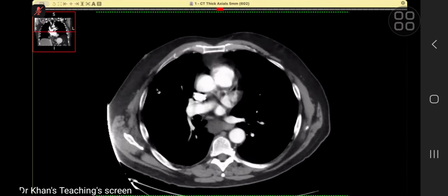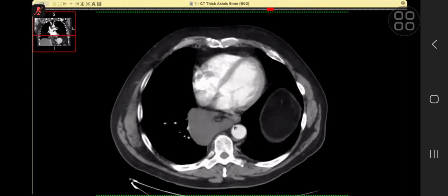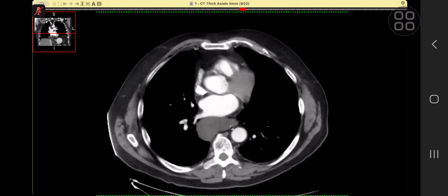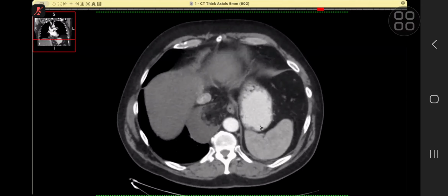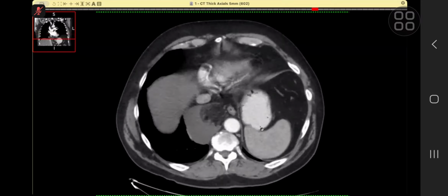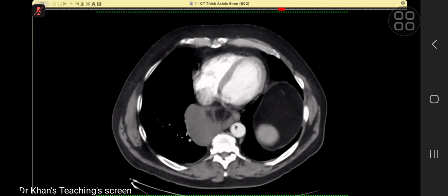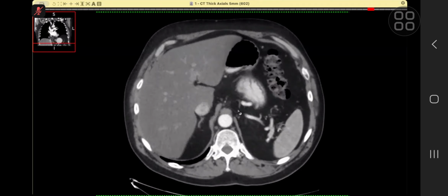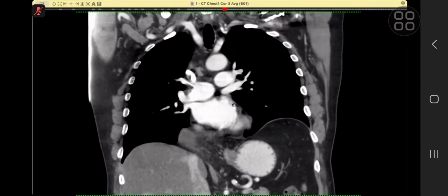And now, in this case, what has happened is that there is a hernia, and with that, there is trapped fluid inside. We call it entrapped fluid. And in your clinical practice, you might have seen similar findings in inguinal hernia many times on a CT scan, where there is trapped fluid. So fluid goes in and it just gets trapped there and should not be of any definite clinical significance. The candidate did well, was looking for any hernia, asked for a coronal, which showed you that here you are.